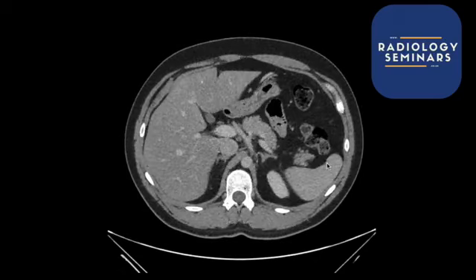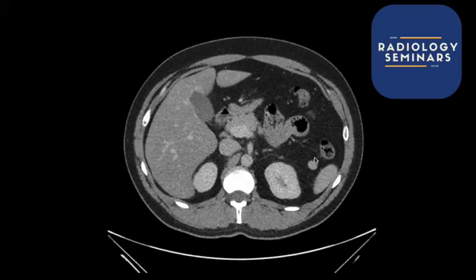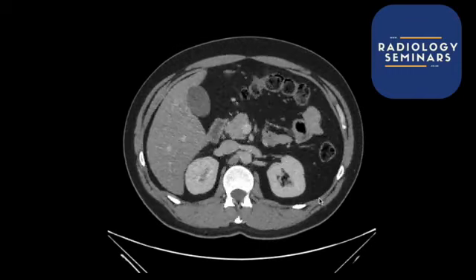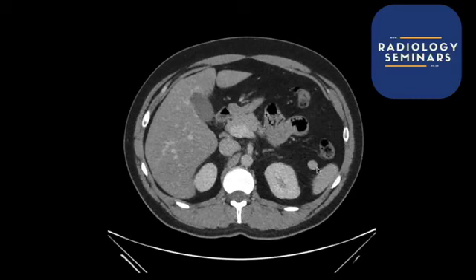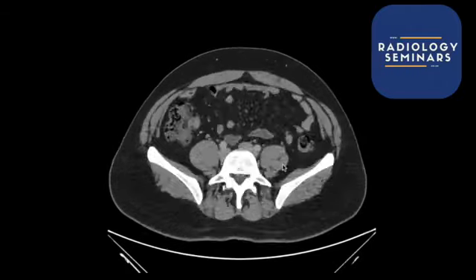What can actually happen is that if someone has a shattered spleen or they've had a splenectomy, bits of spleen can be left behind, and you can end up having these very weird spherical lesions in a few places. That can be bits of remnant spleen that have actually grown over time, and I've seen that a few times. So, if you've got a few circular areas and you don't have a spleen, then you're thinking about remnant splenic rests, I think they're called. So yeah, good, excellent. So bowel can be really difficult.